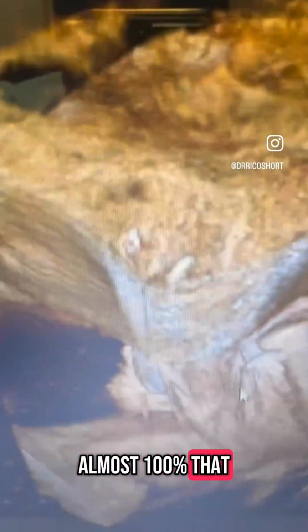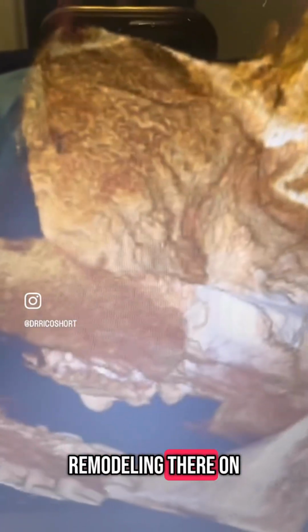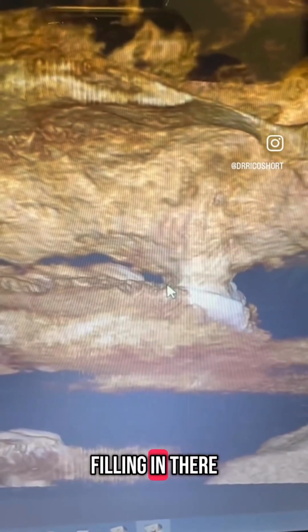Almost 100% of that bone has come back on the buccal aspect. We can see up into the sinus floor. The bone is remodeling there. On that palatal aspect where we saw that defect, the bone is filling in there as well.